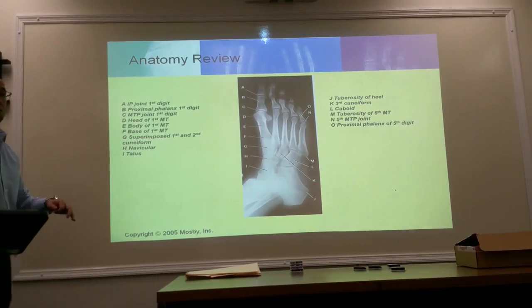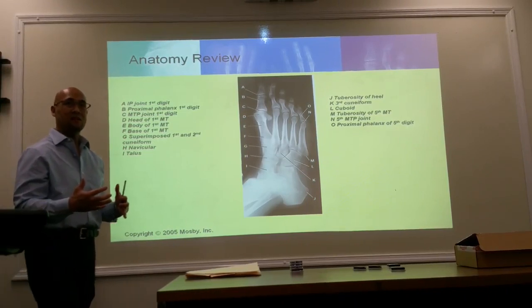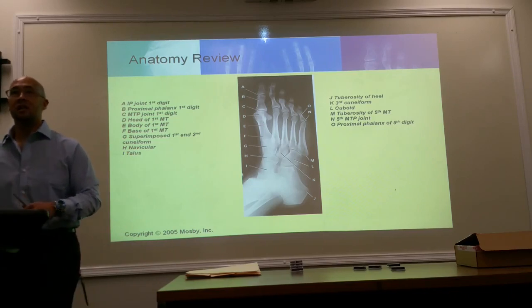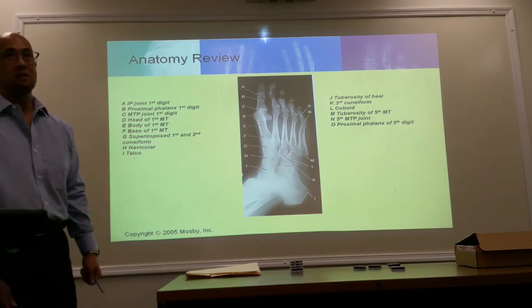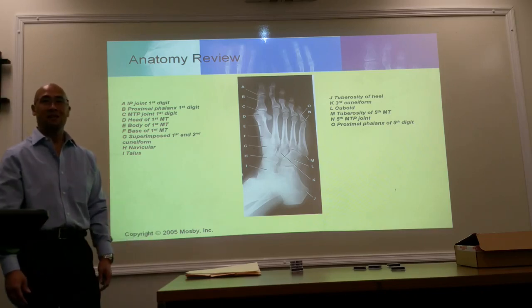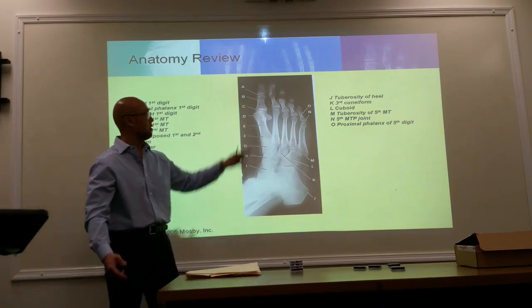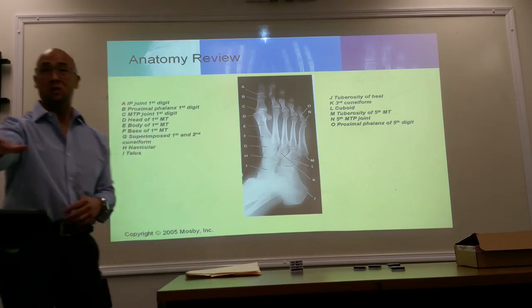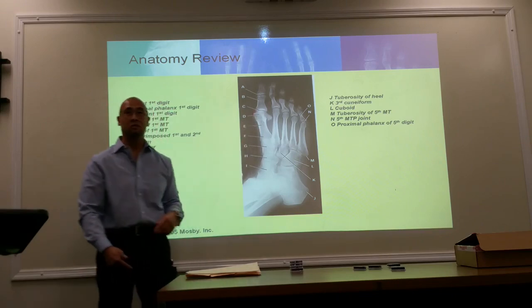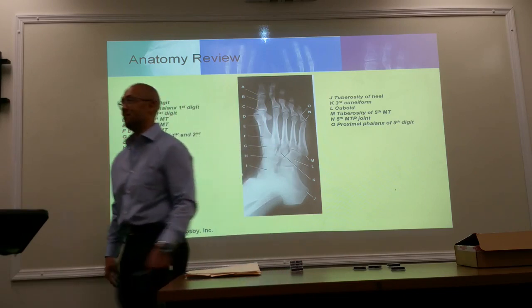Now, again, you guys are detectives, right? Because that's what we do as techs. Which way is the foot rotated? Medially? How do we know? First and second metatarsal here. Well, here's your leg, and it's rotated towards your great toe. You guys are all correct, but I'm going to make it simple for you. Here's the leg, and the leg is rotated towards the great toe. It's turned this way. I'll show you guys. Never mind.